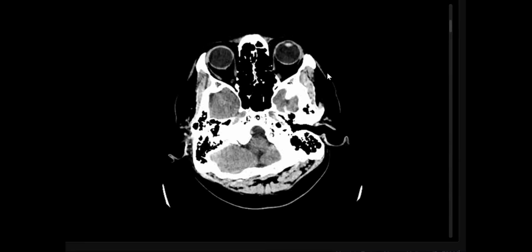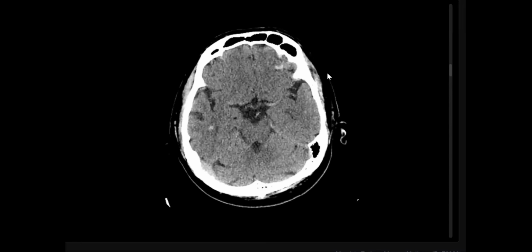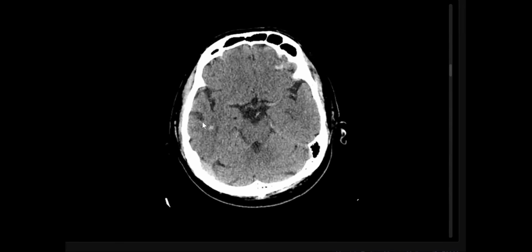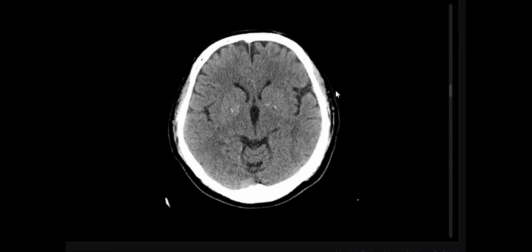In the rest of the brain, in the posterior fossa, I can see there is no midline shift. Gray and white matter differentiation is preserved. There is also hyperdensity in the right temporal periventricular white matter. So there are multiple hyperdense foci of variable sizes, predominantly at the gray-white matter junction in the region of subcortical white matter. Considering random distribution and without any definite mass effect, I will include differential possibilities.